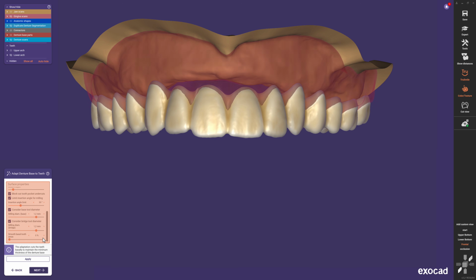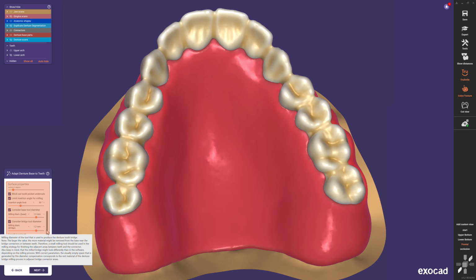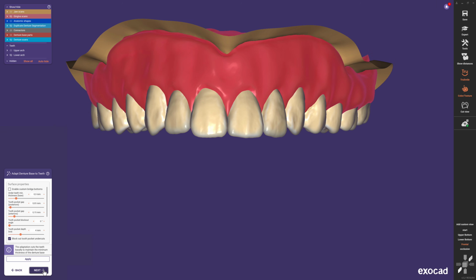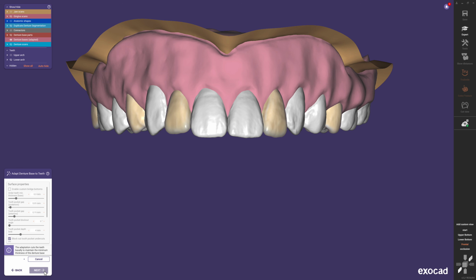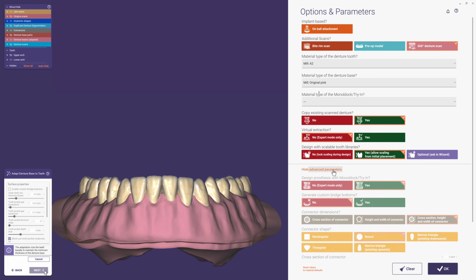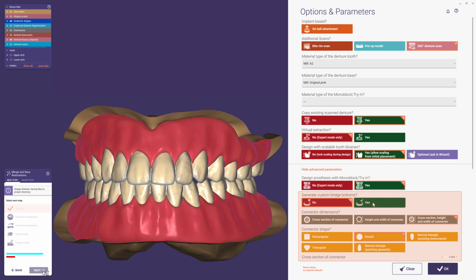If applied, the original base of the prosthetic teeth are discarded, and a continuous, customized bridge base with minimal tooth pocket depth is calculated. Activating this option has advantages in terms of fit and stability, and if we deactivate it, we will benefit from a greater degree of interproximal detail. Feel free to define your default connector type in the DentalDB settings if you like.